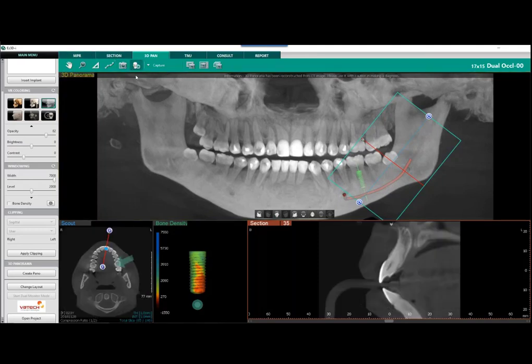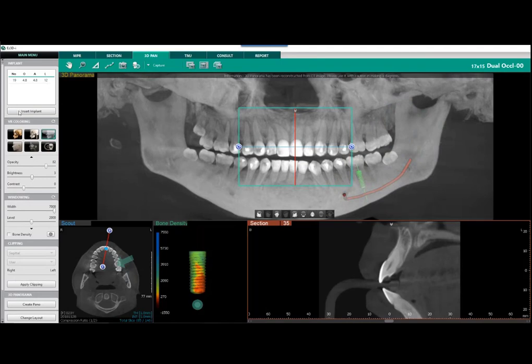Well, what do you think? Any other topics within this 3D pan window? I think maybe just, and you covered it already, but the intervals, I think that's really important. So if we can just maybe touch on that again. And I did get a few questions about that. So if we just kind of take a look at that, that'd be great.